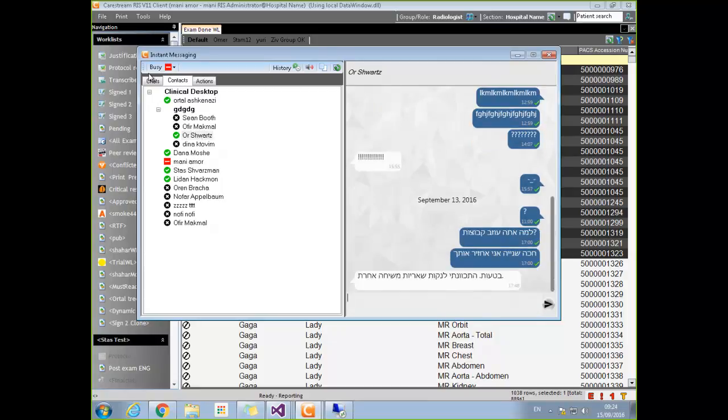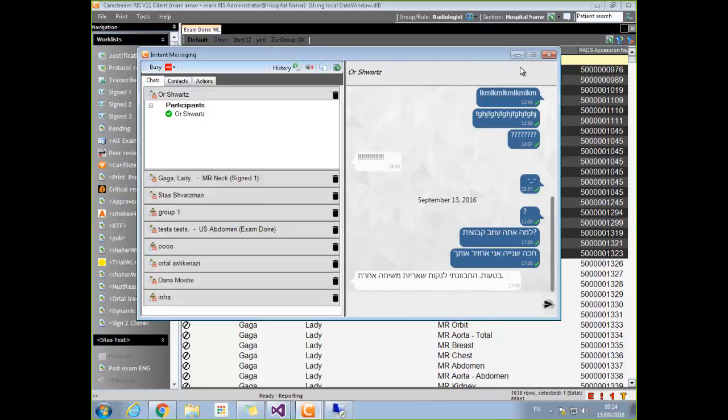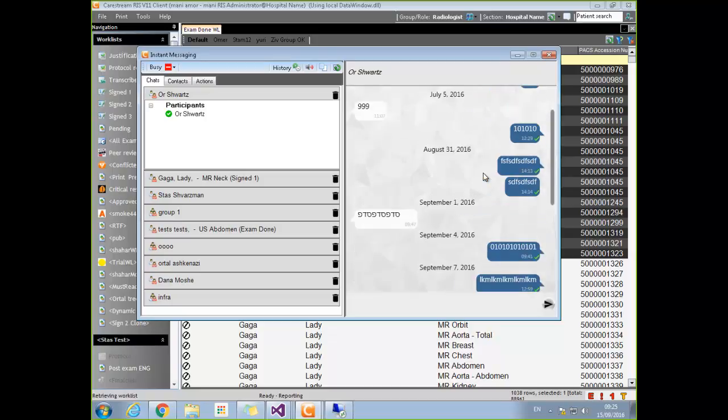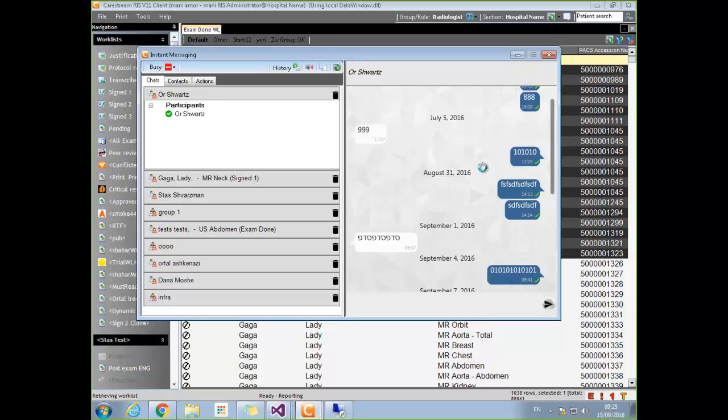With one user, a direct chat not related to the patient. Yes. From here you can drag the study to the existing chat, and it will make it context aware. Currently you could have three or four separate chats for different studies going on at the same time, and switching context is just switching chats. Opening a new chat either from the data window or the work list. So you'll be dealing with the patient when you want to talk to someone else, typically.